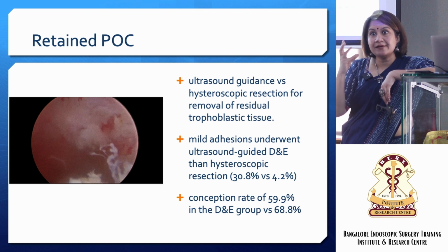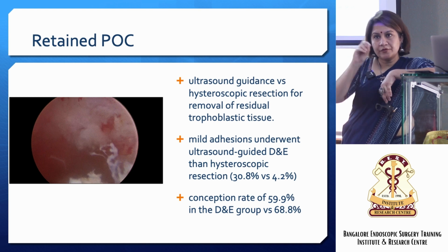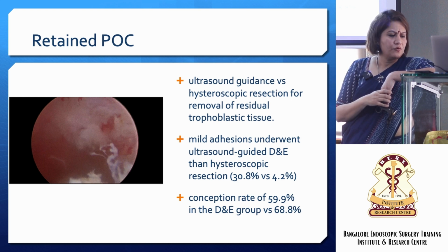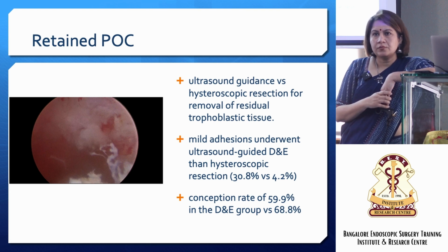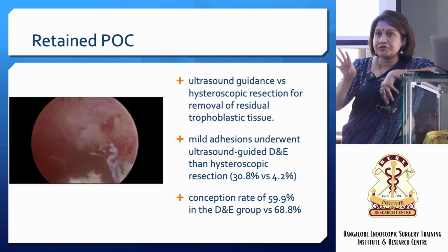Others will think placental remnants, but they appear different. Then I took her for embolization. You could see a nice blush in the myometrium. She's okay now. Baby is around 4-5 months old. So far, no more episodes after that. You can see a nice hyperechoic area in the myometrium.